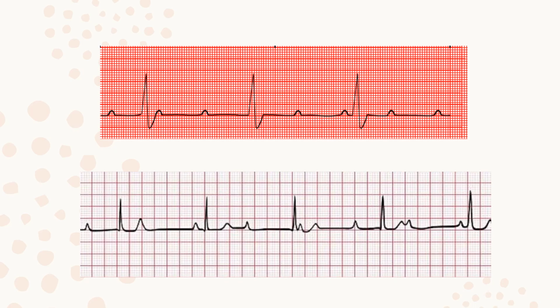More examples of third-degree heart block. The top one, I would say, is very common looking. See how you've got the wide QRS? Because the pacemaker that's pacing the ventricles is down lower. So you're going to have a wide QRS, and then you've got these P's that are just occurring independently of the QRSs. The bottom one, your pacemaker for your ventricles is obviously up high in the bundle of His, or very low in the junction. But once again, you have way more P's than you do QRSs. There is absolutely no association between the P waves and the QRSs.